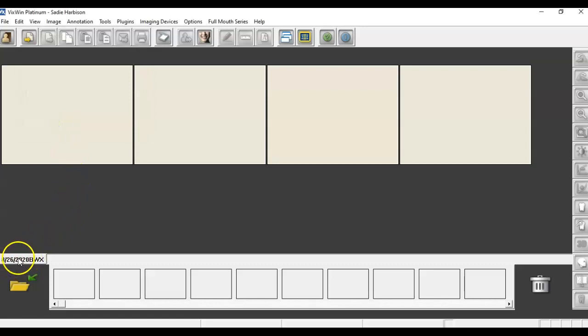So now you have this. Now they know by looking at this whole bar, because this whole bar will be filled with images if it's a patient that's been coming for a long time. And now the doctors know instantly, oh, on 8/26 they had bite wings, because then they don't have to click through them all. They'll just have this long list of dates identifying what's there.